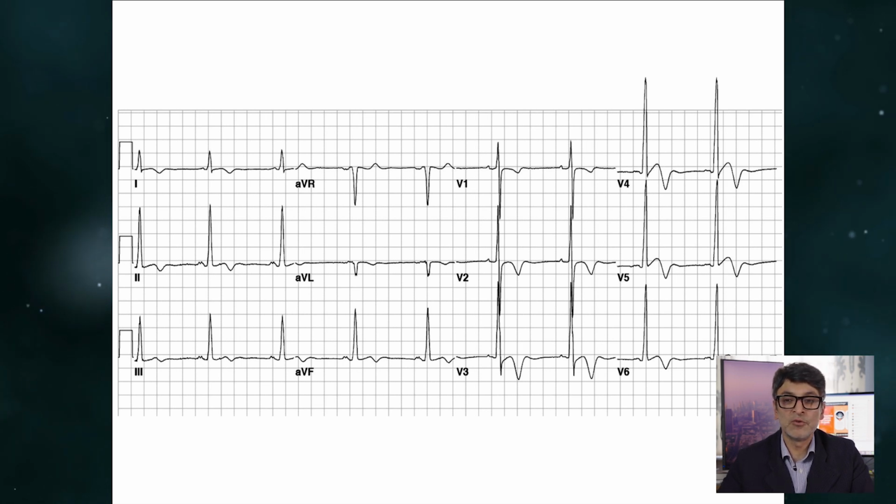So let's assume you're reviewing this ECG. He's asking you to sign the form. The question is, do you sign this form off on the basis of this ECG? So the first thing you do is you note why you're doing the ECG and who you're doing it on. You're doing it on a slightly arrogant young person who is desperately keen to get you to pass them, and they're asymptomatic, but there is this family history of sudden cardiac death. And what you don't just do is look at the ECG and yell out normal or abnormal. You use a 10-step system.